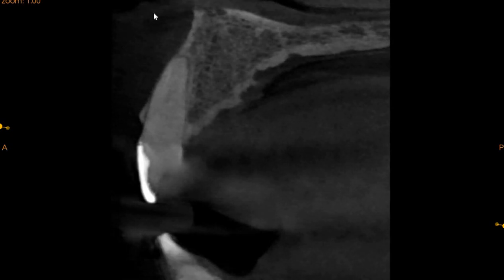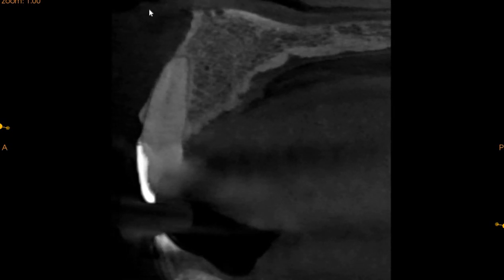Moving to tooth number 2-1, we've got a very faint canal morphology here. We can't see any chambers, so this is going to be a relatively sclerotic tooth and discolored tooth as well. We don't see any periapical pathologies associated with this tooth or the other. No fractures, horizontal or vertical, can be appreciated, but at 75 micrometers for this case.